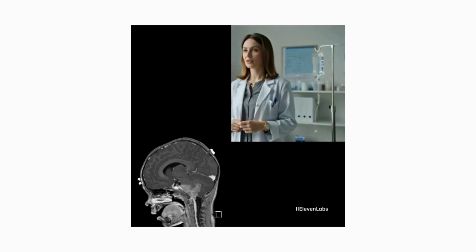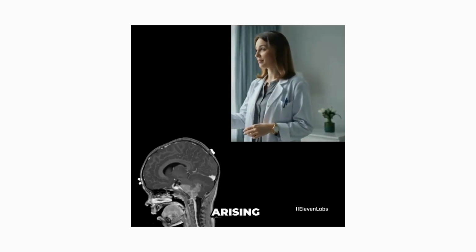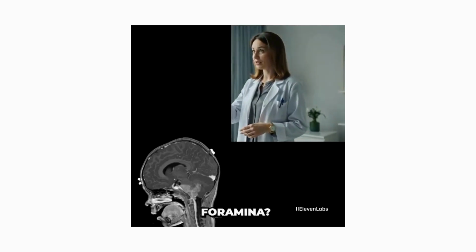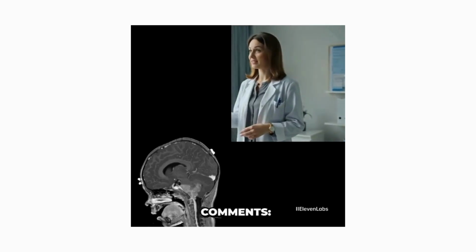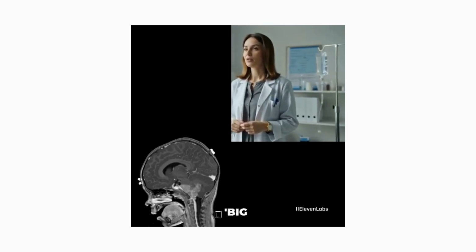Before we dive into the lecture, I want you to look closely at the growth pattern. Is it arising from the roof or the floor? Is it squeezing through the foramina? Pause the video and leave your initial diagnosis in the comments: medulloblastoma or ependymoma. Let's break down the big two.